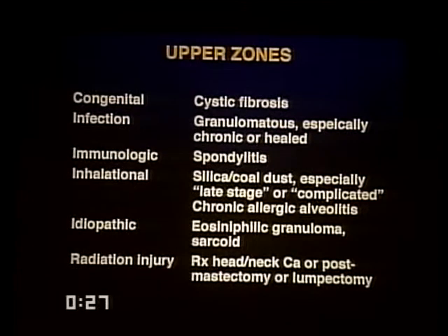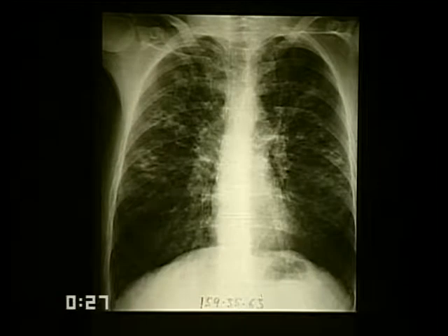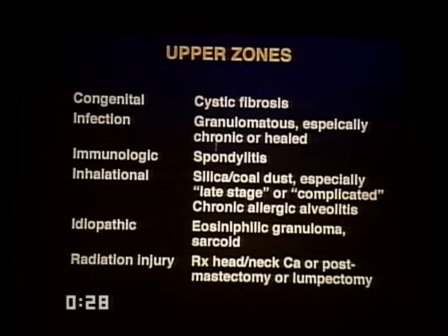We occasionally are very surprised by finding adults presenting for the first time with cystic fibrosis. And the disease is characteristically, of course, large lungs, and often dominantly an interstitial abnormality in the upper lobes where the bronchi are thickened. But as you can see, there are a variety of other disorders, and many, many more are listed in the classic list that we all refer to.